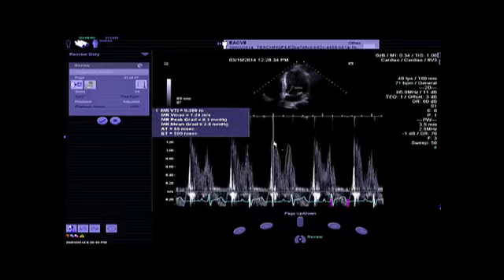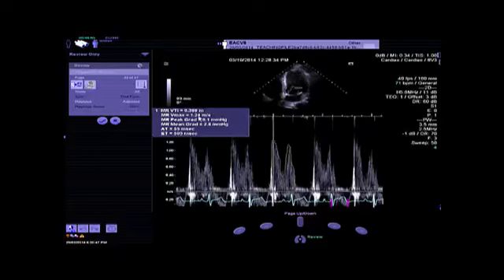And you know, when the E velocity is 1.5, this is in favor of severe mitral regurgitation. It's a semi-quantitative sign or parameter. But in this situation, we have 1.2, again in favor of moderate to severe mitral regurgitation. But importantly, what we can assess is the time velocity integral, and you have the measurement here. Why? Because we will compare this with the time velocity integral of the LVOT flow.